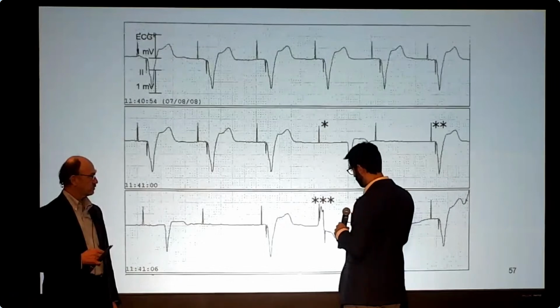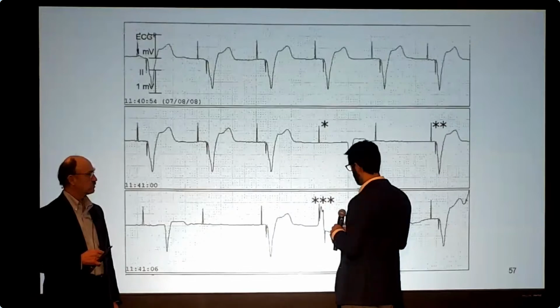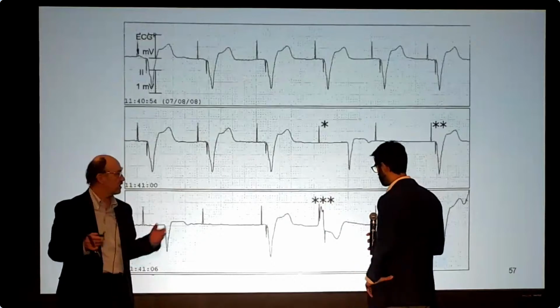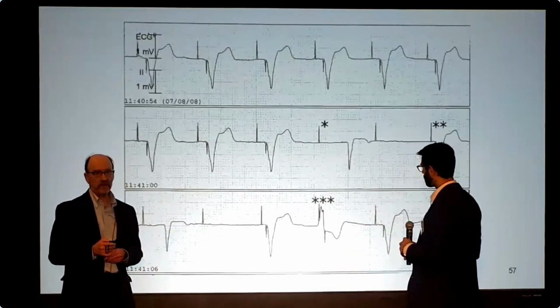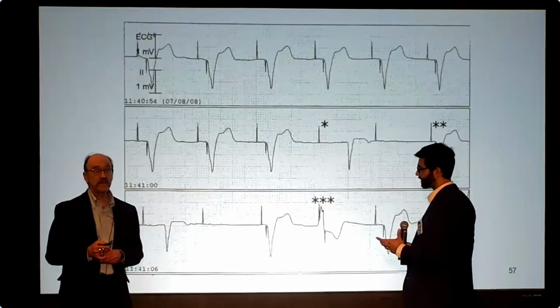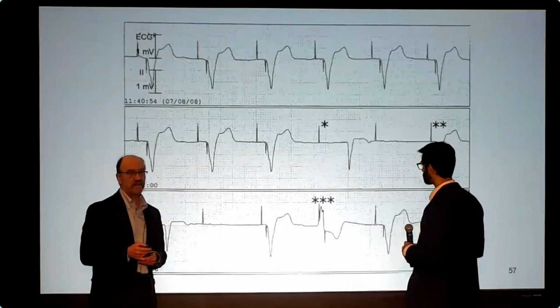And then we have V-pacing because the PVC falls in the atrial blanking period. So then the device tries to pace the ventricle because it doesn't see what it needs to. What happens when a PVC or an R wave, a conducted R wave, falls into an atrial blanking period? If you were a pacemaker, you want to make sure someone's not asystolic. So what do you do? You V-pace. And what is that called? Safety pacing. You V-pace with a short AV interval.